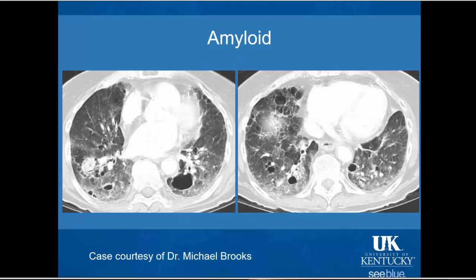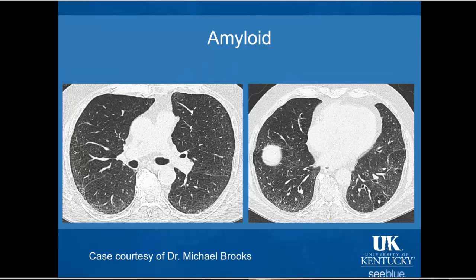So here's another one where we see more interlobular septal thickening and more diffuse ground glass, but again with some lower lung predominant thin-walled cysts. And again, even in some of those areas where we have this nodular consolidation, we're seeing this unusual cystic abnormality surrounding those.